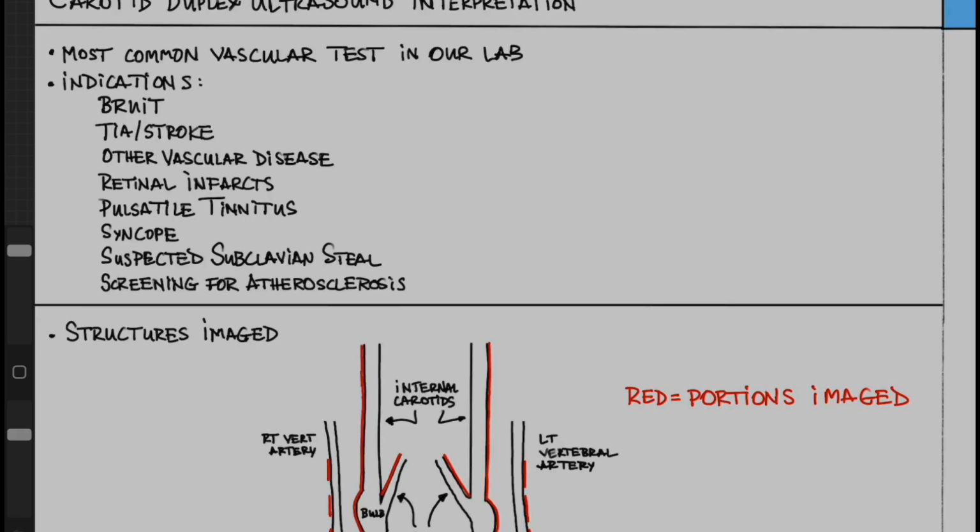Let's do carotid duplex ultrasound interpretation. So this is the most common vascular test in our lab. About half the tests are carotids. The indications are listed here. Probably should have put them in order of most common.